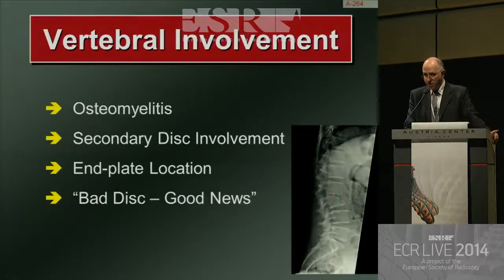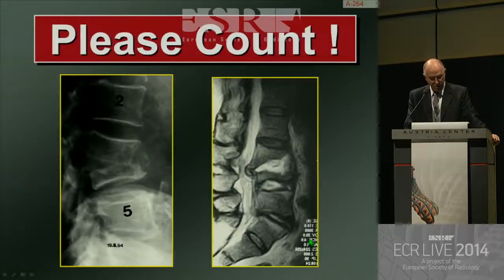And if I could just give you one take-home message, it is definitely this in the metabolic bone disease patients. Please always be aware that the figures are quite high, that 1% to 2% of patients who present with vertebral fractures actually have an infection as the cause of the vertebral collapse, not a benign etiology. And this is also important when you are interpreting your film, how easy it is initially to think that is one vertebral body which is fractured, as opposed to very severe bone loss of both vertebral bodies with a fluid here, which will, of course, mislead you if your interpretation is not right.